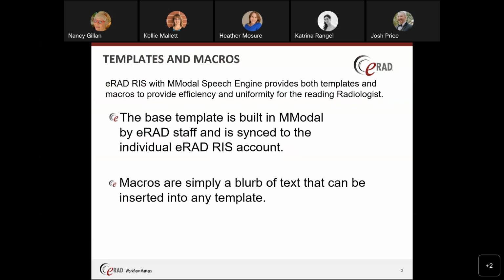There's a little confusion between macros and templates because they are interchangeable on other vendors' systems. In eRAD, we have both templates and macros. Macros are simply a blurb of text that can be inserted into any template. And templates are the entire report structure.